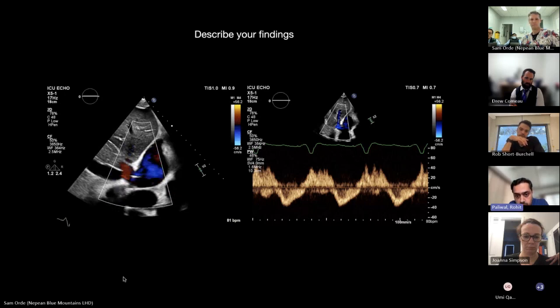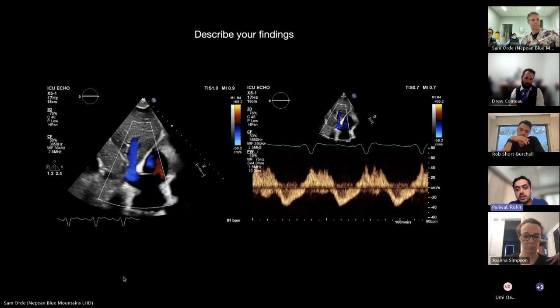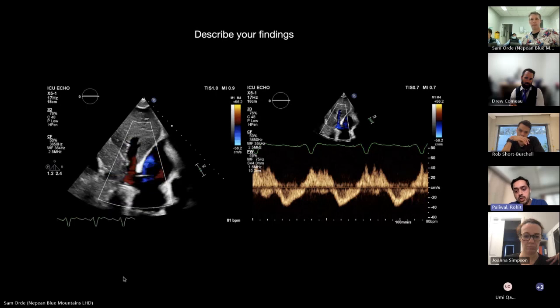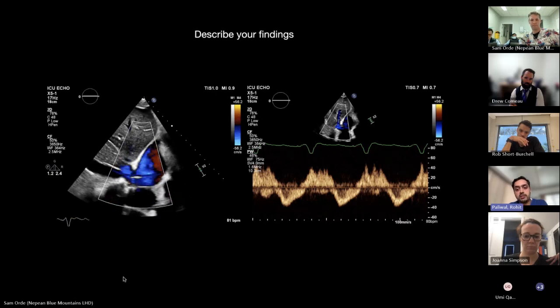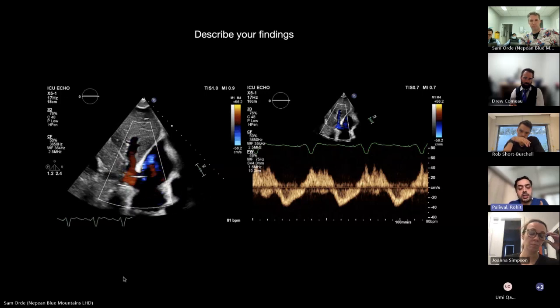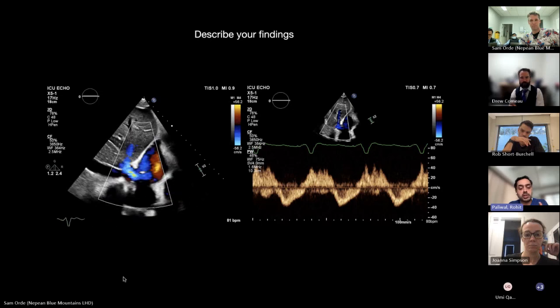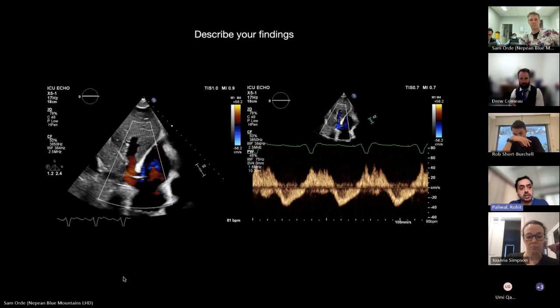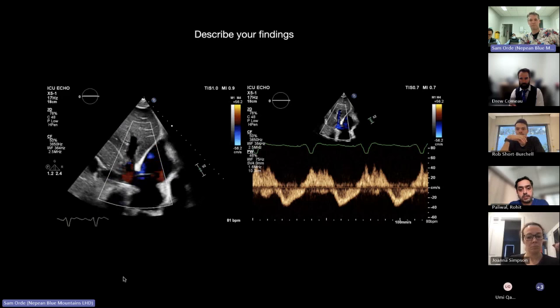And what we're seeing, so with the ECG, is systolic reversal of flow. So we can see some flow above the baseline, which basically represents the reversal of flow. And then the diastolic flow is normal, which is towards the IVC. So this would again be concerning for increased right-sided pressures or severe pulmonary hypertension or severe tricuspid regurgitation, but essentially right atrial pressures are severely increased. Thank you very much.